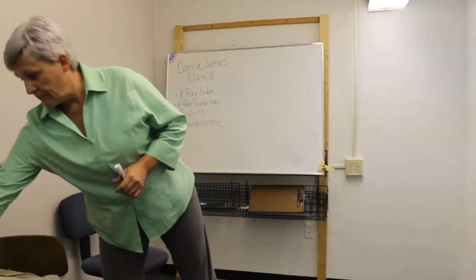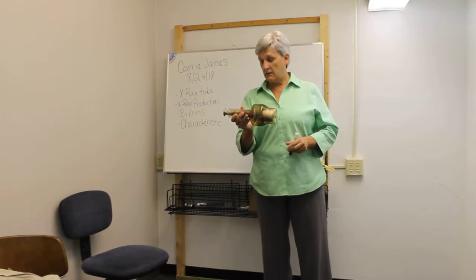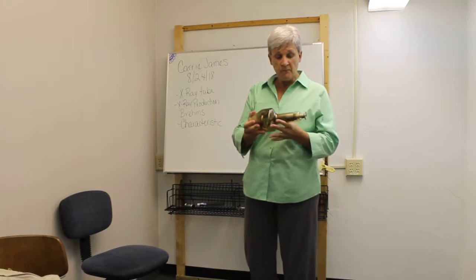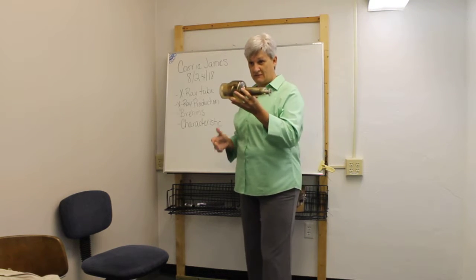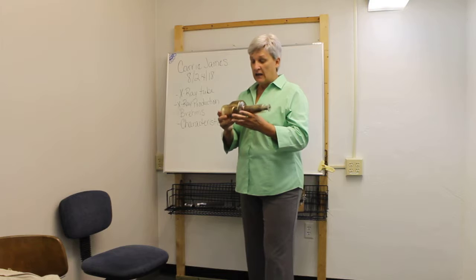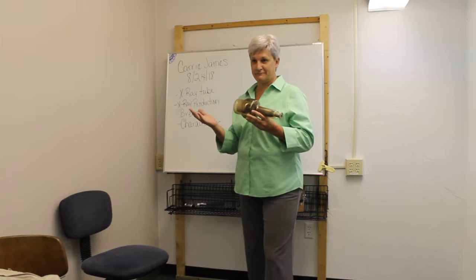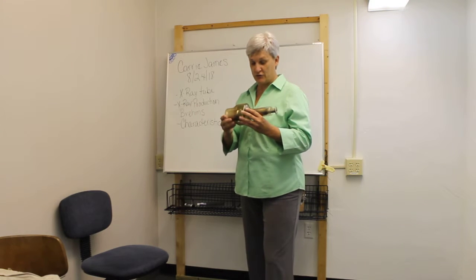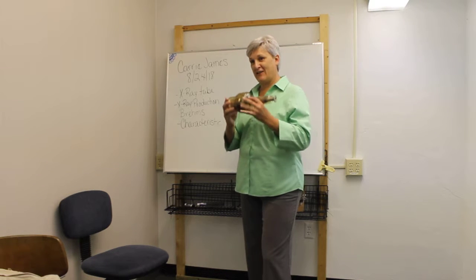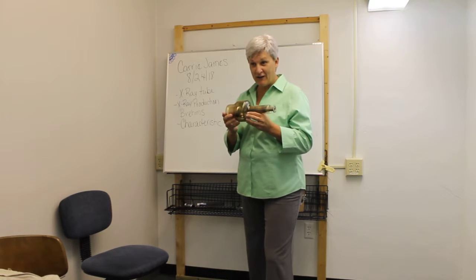First of all, we have this device. It's an X-ray tube, and it is inside the X-ray housing. This is the essential element for X-ray production. If you don't have this, you can't produce it. And X-ray production is a very inefficient element of producing X-rays. We only get 1% effectiveness out of this thing. And if you had anything with 1% effectiveness, you'd probably get rid of it, right?